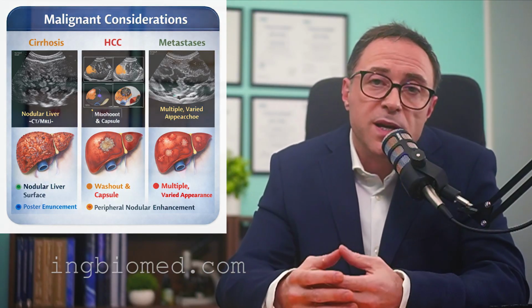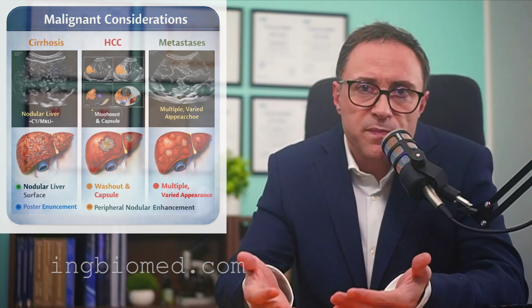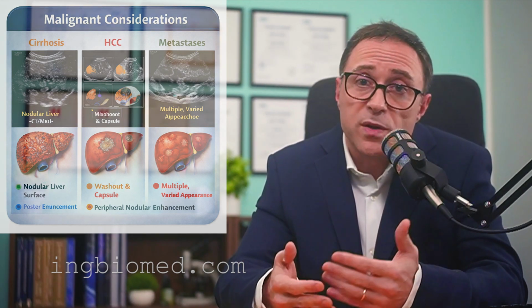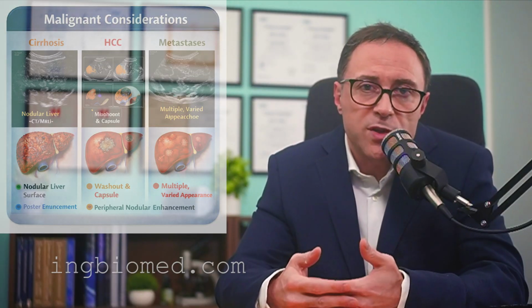In summary, liver ultrasound is not merely a technical examination. It is a dynamic process integrating anatomy, hemodynamics, and pathology. A structured approach combined with solid knowledge of vascular patterns and parenchymal behavior allows us to provide high diagnostic value in both routine screening and oncologic follow-up. This is the foundation of an effective and clinically meaningful liver ultrasound assessment.